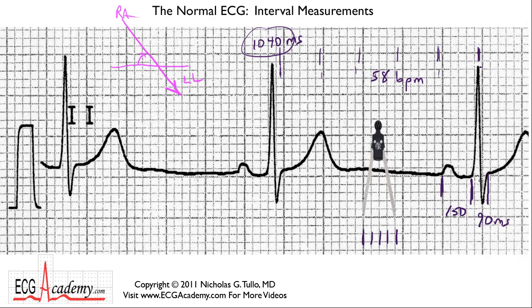Now, let's look at another QRS complex, just to double check, because after all, there are a couple here. Now, you can see the QRS ends just before the heavy line, and it starts just before this light line. And so you have 2 boxes almost exactly. And here as well. I mean, I think perhaps on second thought, this is probably more like 80 or 85 milliseconds.